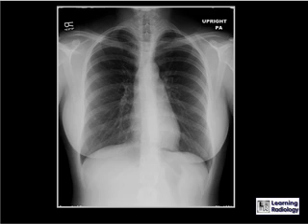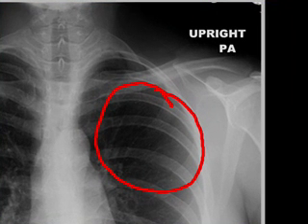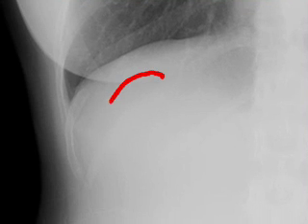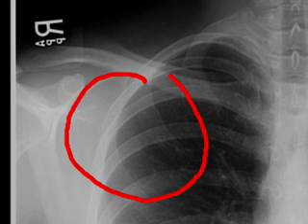How this works in everyday practice is shown on this frontal chest radiograph. We can see air density here in the left upper lobe of the lung. We can also see air density in the room surrounding the patient. We can see fat density in the chest wall. We can see fluid or soft tissue density in the right upper quadrant of the abdomen with the liver. We see bone or calcium density in the clavicle, scapula, and ribs.